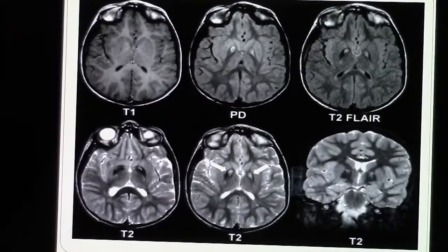Today we're going to start talking about a brain MRI, and this is going to be our first lecture on how to read brain MRI. This lecture is going to be mainly an orientation about the brain MRI, the sequences of the brain MRI, the cuts of the brain MRIs, and what is the importance for each cut of the brain MRI.